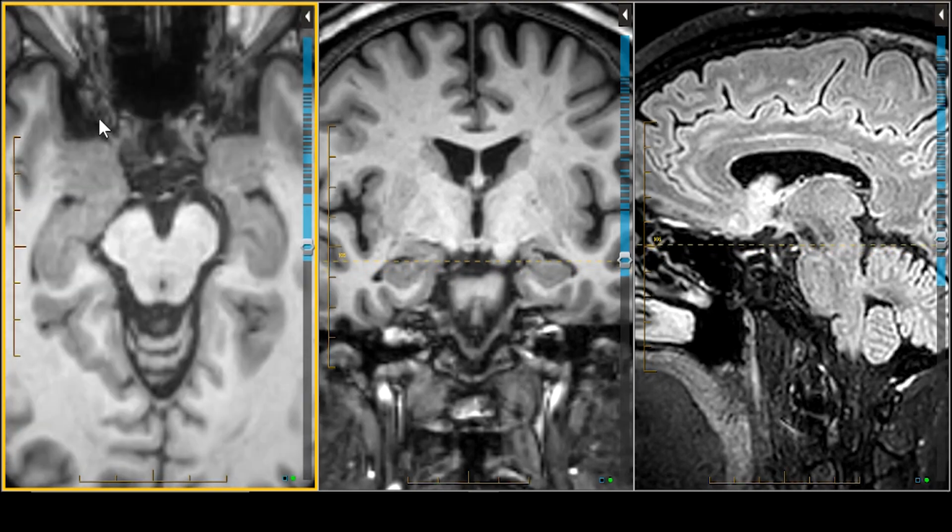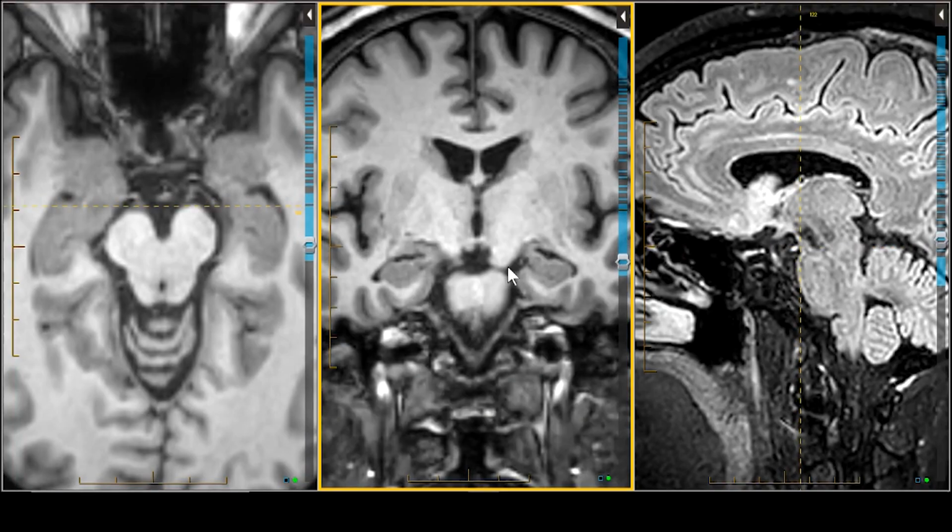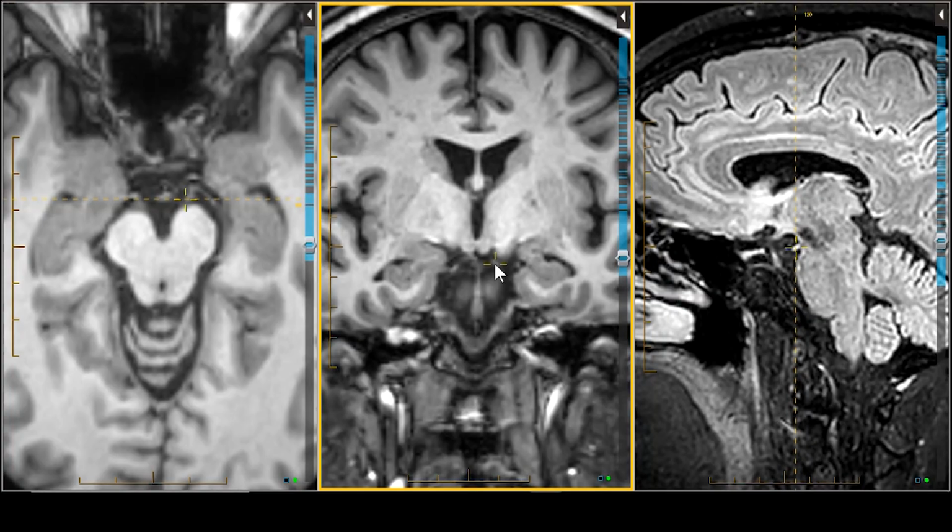So that's pretty easy. Another tip-off to finding it is to locate the posterior cerebral artery. Now, we said in our first vignette that masses around the posterior cerebral artery or the superior cerebellar artery can compress the third nerve. But the classic compression of the third nerve as an aneurysm comes from the PCOM, which you all know is a more common aneurysm than either of these two other arteries. So PCOM aneurysms will be in close apposition to the third nerve and may produce a third nerve palsy. But once you find the PCA, you'll know that the third nerve is going to be right nearby, and it is.